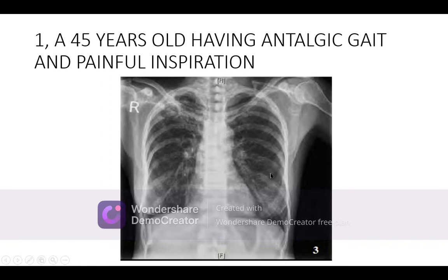Because in the blood vessel there is blood in comparison to the other part, for example here or here, the bone is actually demineralized. So the blood column is going on, which differentiates the sites, and it causes the Looser zones. It causes the impression of pseudo fractures, which are not actually fractures.